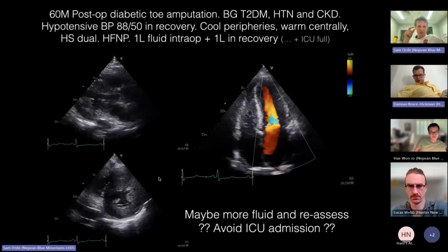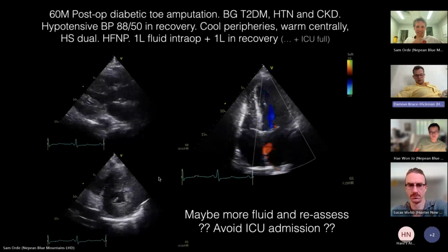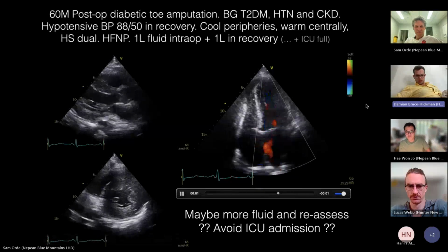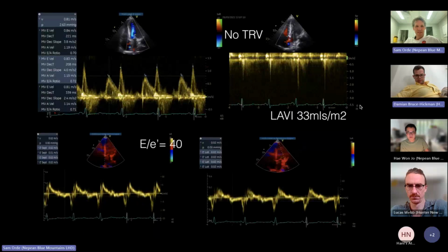What do you think about the left ventricle thickness? Yeah, so it looks like there's fairly concentric hypertrophy in the parasternal view below. I'd like to measure it. Looks at least 1.5 centimeters, if not more, there. Yeah. Nice. And so here you go. What do you think of all of this?